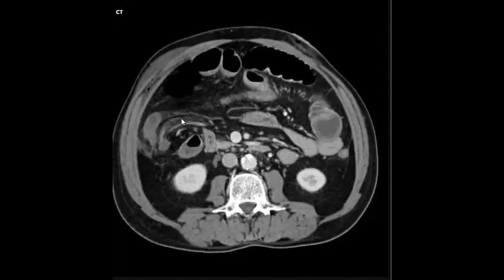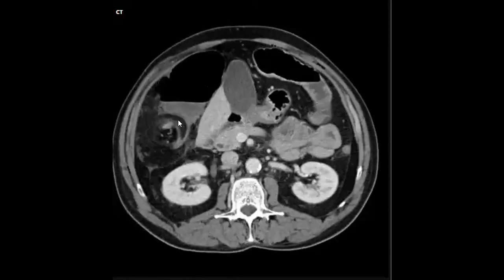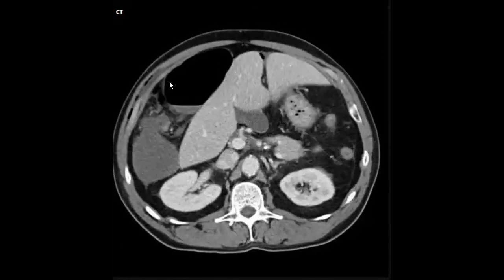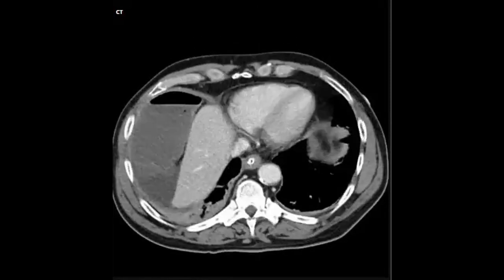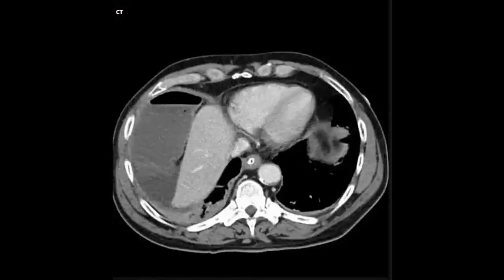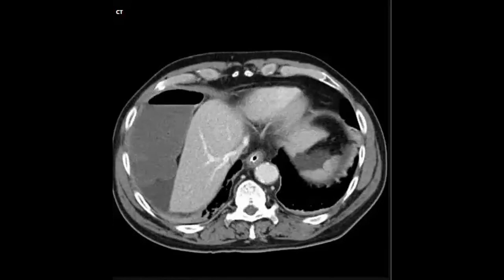Here you can easily see that there is a volvulus. Yes, perfect. Here there is some sort of volvulus of the bowel loop. I am sure that you need to check the rest of the reconstructed images, especially the coronal if present, but you can see there is possibly a cecal volvulus here.